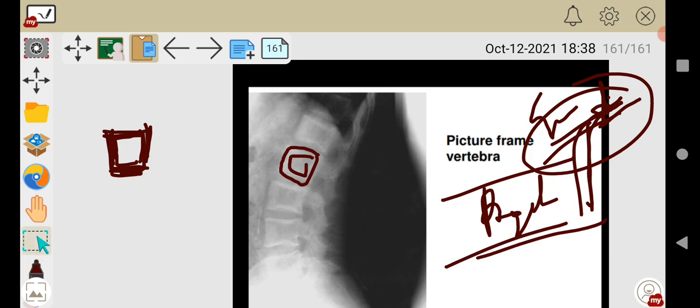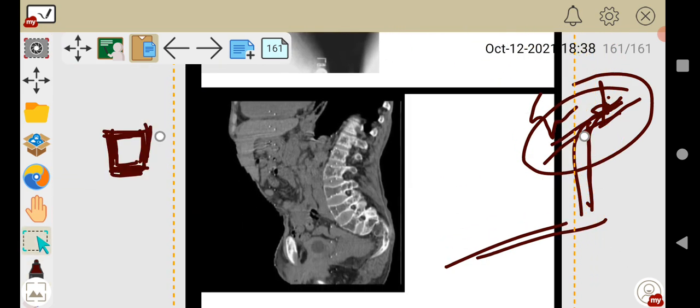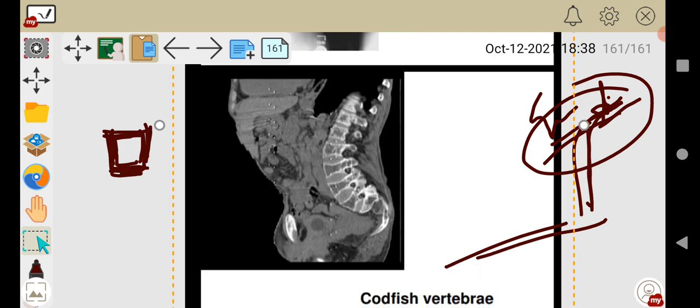So anyway, so many things in pediatrics, I will discuss that in orthopedics, right? Okay, so see this one. This one is actually not a characteristic image that we will get in exams. Anyway, don't follow this one. One second.